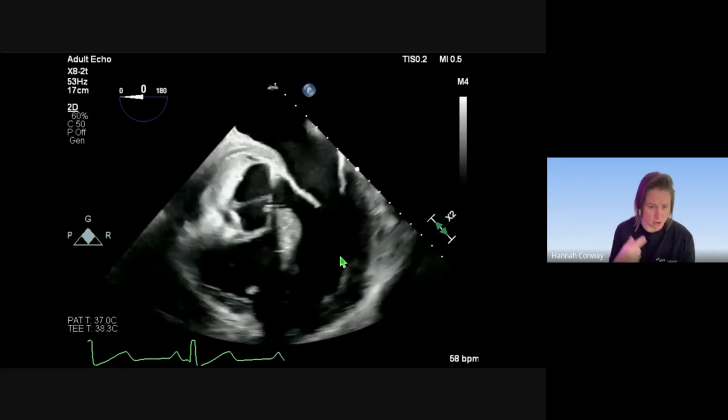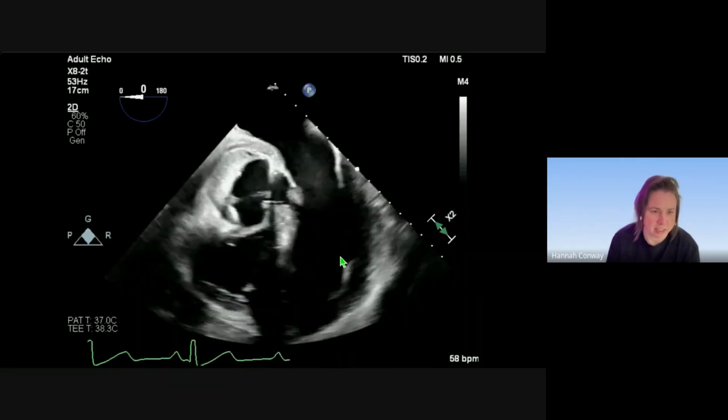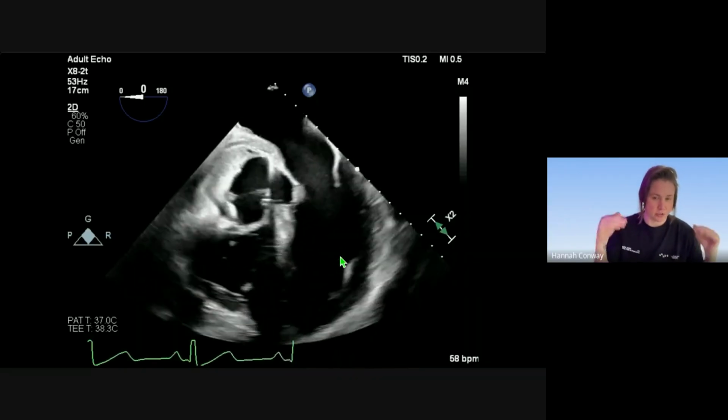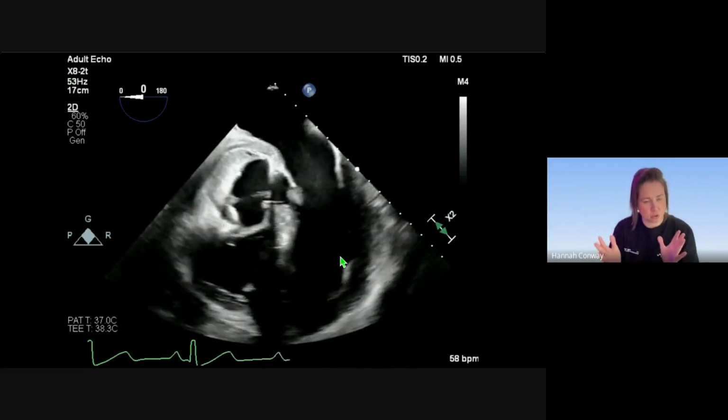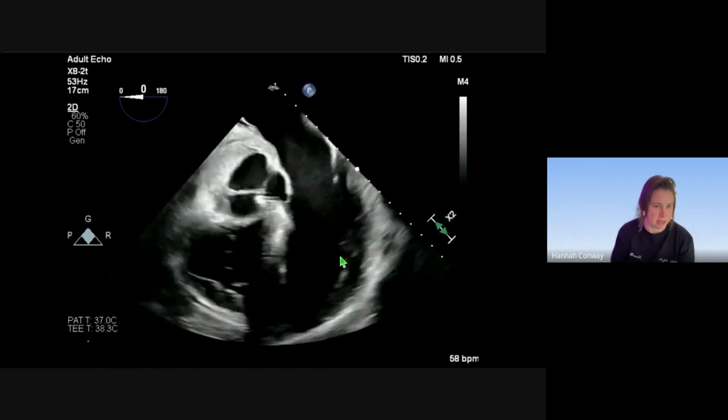So that conversation will happen between anaesthetist and surgeon as to primarily where the extension of the flap originates from. They're really concerned about whether the actual aortic valve has been affected, and if there's any regional wall motion abnormality because the flap has gone down to the coronary ostia.